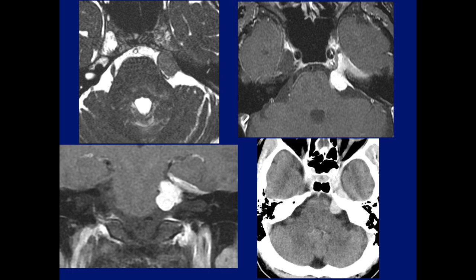Correct. As Asif said, we read this case out as meningioma. Again, notice the marked enlargement here. Is it just pushing the trigeminal away? But it is going towards Meckel's cave, and we see the spread along the dura, which would be very unusual for a schwannoma.